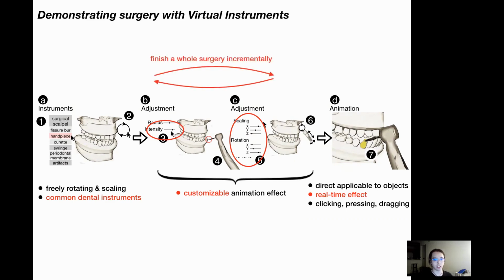Since a surgery can consist of multiple steps using different instruments, our tool enables the demonstration to be done incrementally by applying multiple instruments on a single 3D dental model.